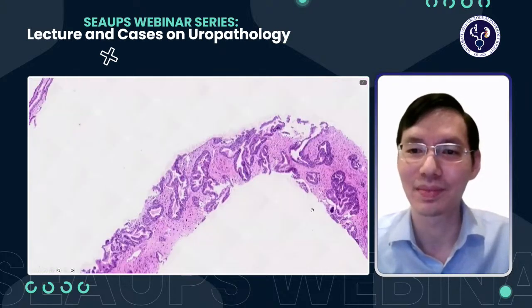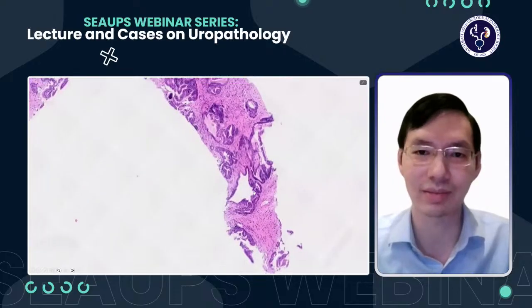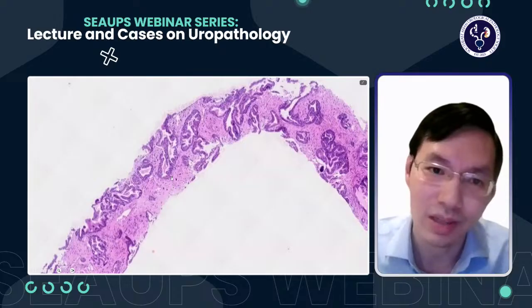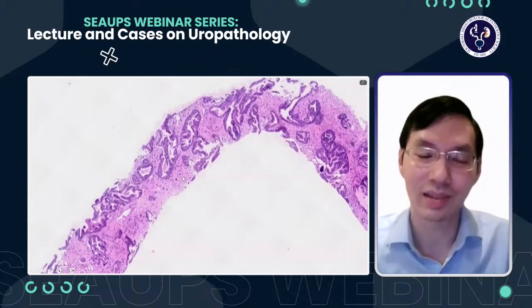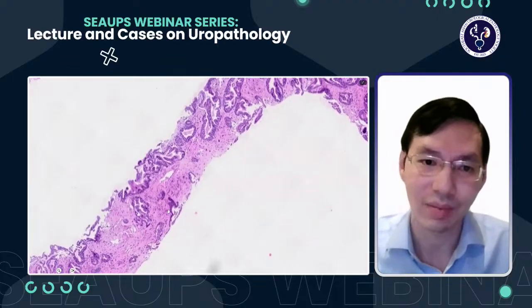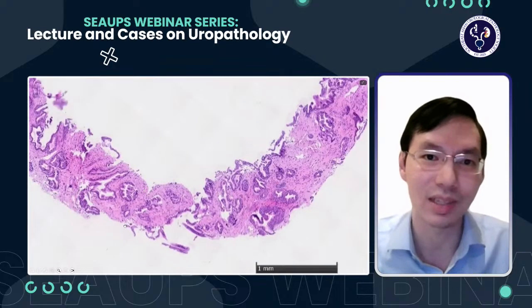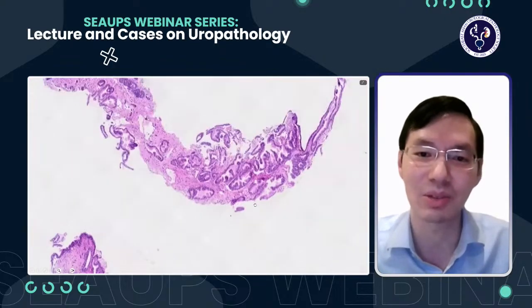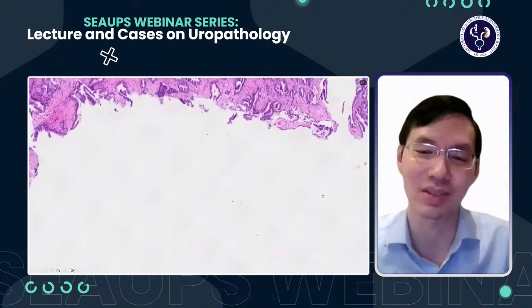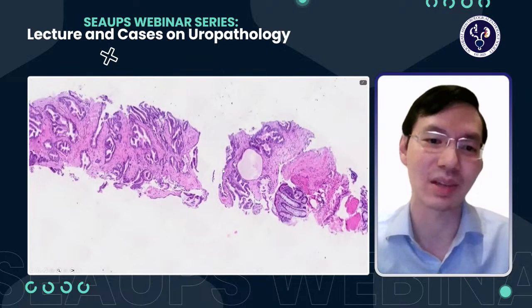And he said, really? Don't you think the stromal cells look kind of weird? And then I went back and looked again, and I started seeing that the stroma is littered with these cells with hyperchromatic nuclei. And yeah, he was right. I missed it. I was too focused on looking at the glandular component, which most of the time is going to be prostate cancer, right?